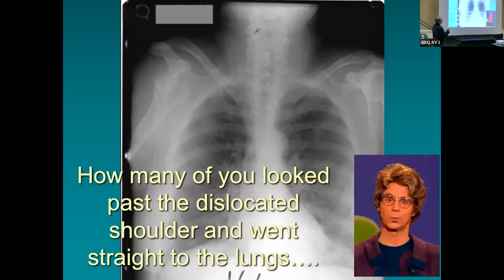Yeah, don't forget, use your system on this one. Use a good systematic approach to look at your x-rays. And again, it's easy just to go straight to the lungs right here instead of remembering your steps. So remember, make sure that's lined up. You've got good angles. Your clavicles are lined up appropriately.